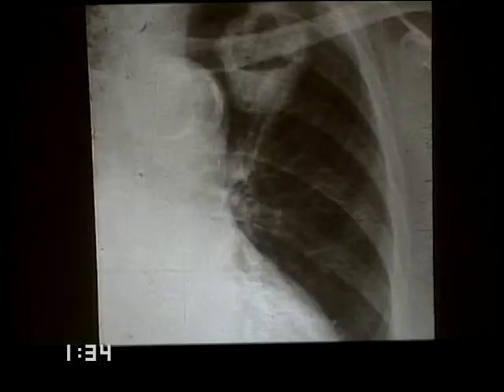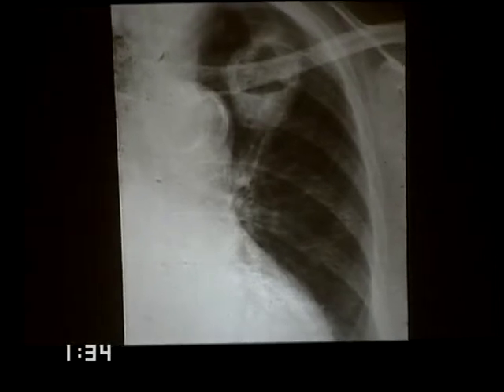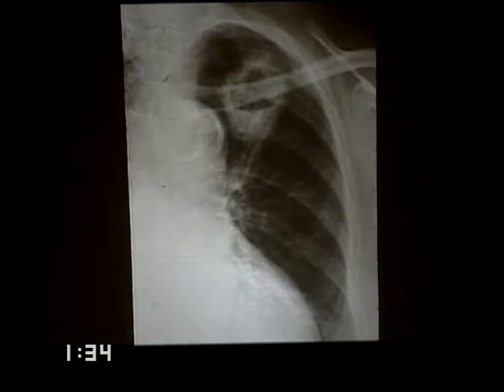And finally, just to remind you, lung cancer may cavitate. Classically, they should be squamous cancers. In reality, they are more often adenocarcinomas, of which this is an example.